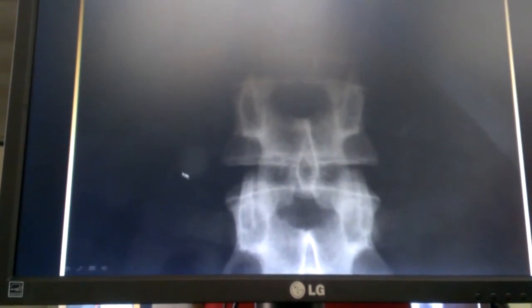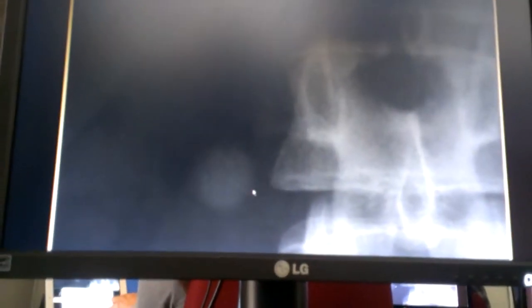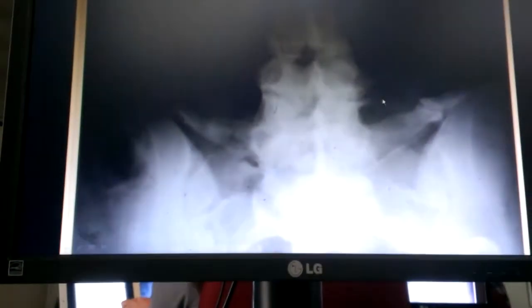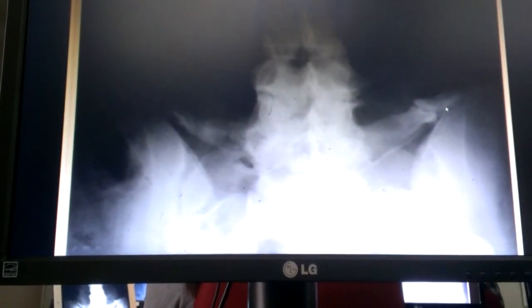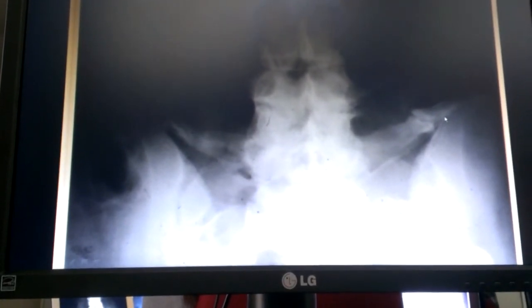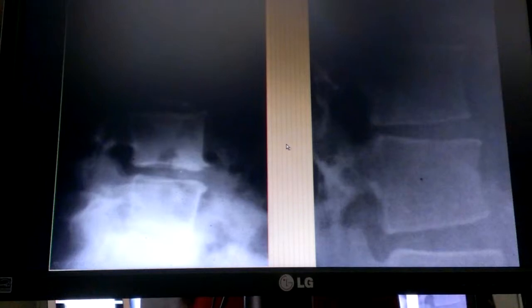This here, unless it's something on the cassette, is perhaps a gallstone, cholelithiasis. I'm not going to test you on that. This is just a close-up of the same. Okay, iliolumbar ligament calcification. I had mentioned before that it could indicate intersegmental instability, and that's why ectopic calcification has arrived there to fortify that ligament.